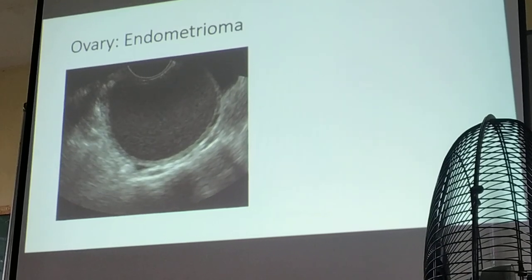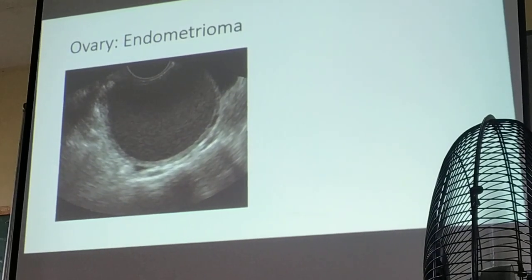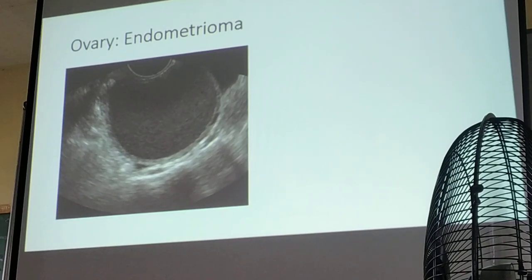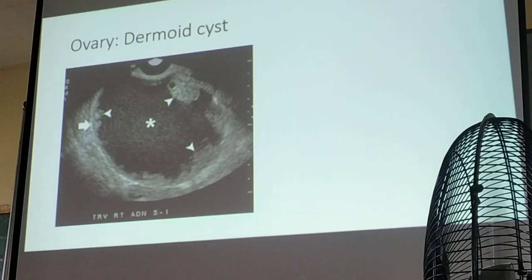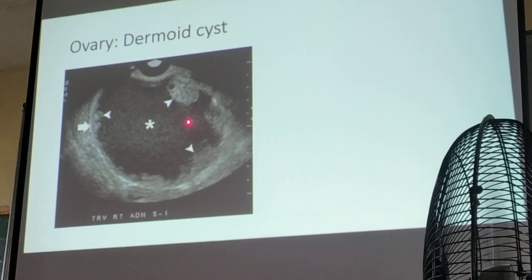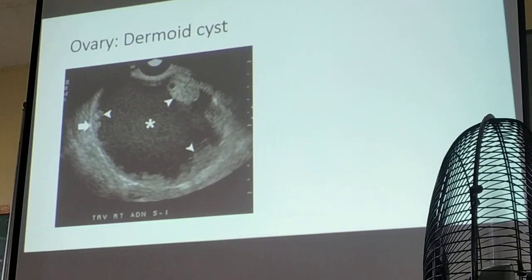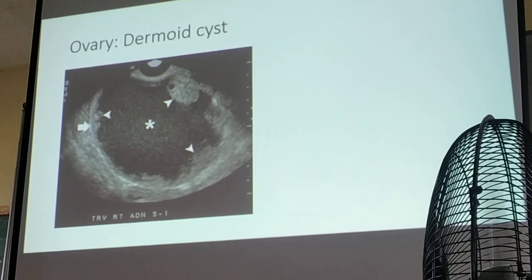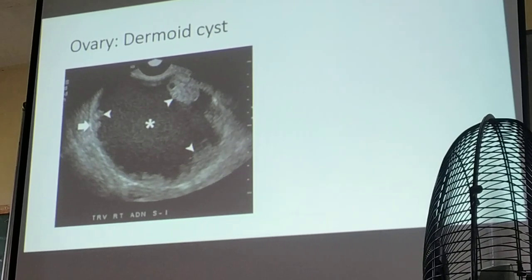There you have the endometrioma. It looks solid, right? It looks solid, but definitely this is cystic. There goes your point of differentiation. If you would see hyperechoic structure, meaning gray to white structure, within the homogeneous hypoechoic structures of the dermoid cyst.